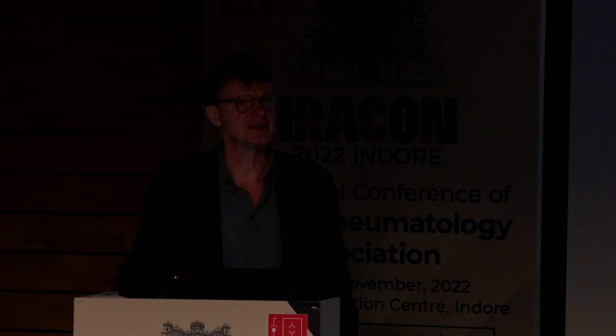And then I would suggest that you move through it fairly quickly, so that you get an idea of whether there's a lot of pathology, things that catch your eye. Then you go further back, and then you go back again, just to see if there is something massive that you think you should look at. Then you start from the anterior end, look at the slices, look at both T1 and STIR. Often you will start with the STIR, but that's up to you. See, do we have any areas with a lot of bone marrow edema? Because that's what we look for there. Or other signs, other fluid-filled things.